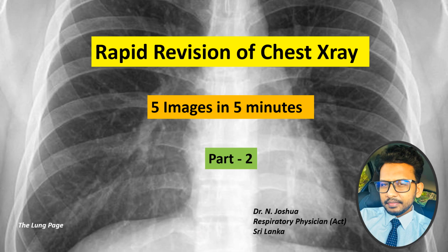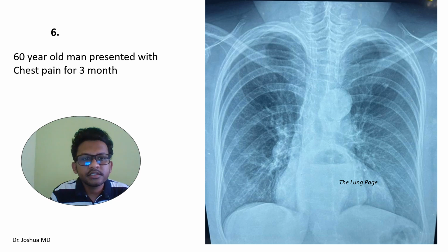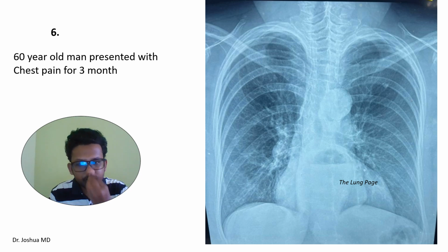Today we are going to see part 2 of the rapid revision of the chest X-ray, 5 images in 5 minutes. So the history is a 60-year-old man presented with chest pain for 3 months duration. So what is your diagnosis of this chest X-ray?